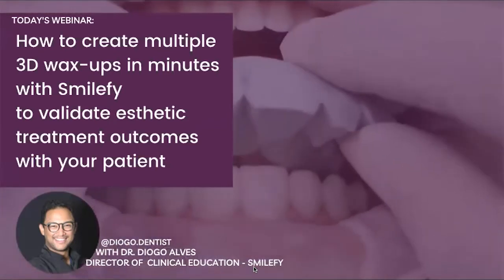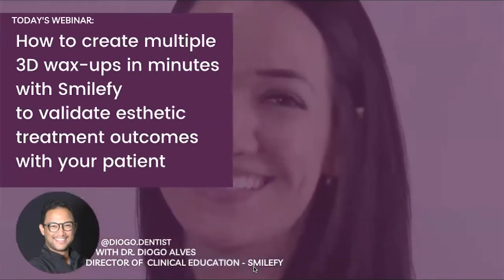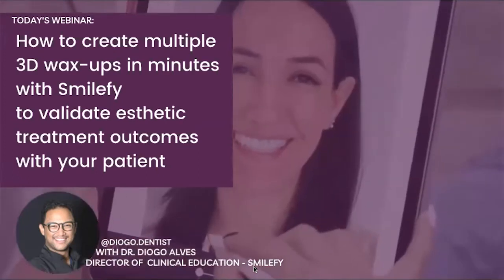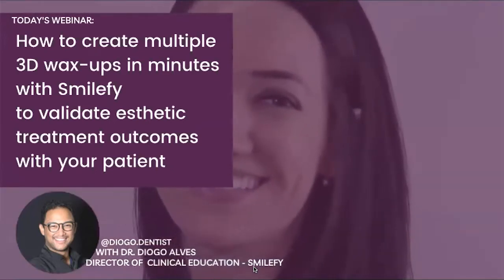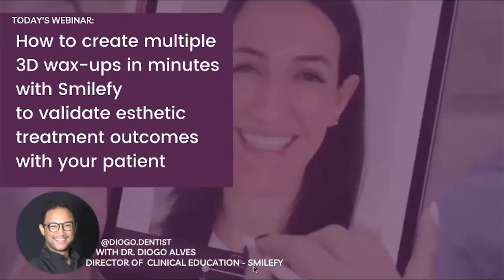As for a general dentist, the software allows you to better educate yourself and also educate your patients towards the treatment. For the prosthodontist, it gives you the chance to select different teeth shapes just by clicking a couple of buttons here on this SmileFy software.